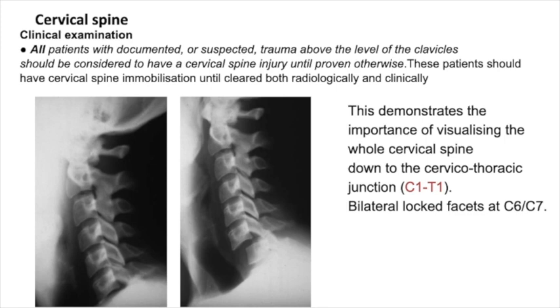in the first X-ray because the X-ray was not properly done. So we have this patient with this symptomatology. The X-ray looks negative, but we see there are only 6 cervical vertebral bodies. So we send the patient back, and then we repeat the X-ray, and we find out there is a fracture between C6 and C7.